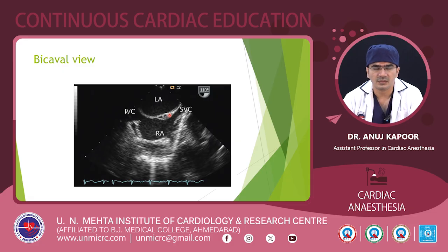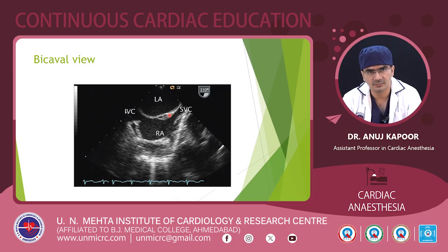So this completes our examination of the interatrial septum, and how to evaluate the interatrial septum completely in the OT or in the cath lab while doing a device closure. The further lectures would be on the types of defect and how to assess them.